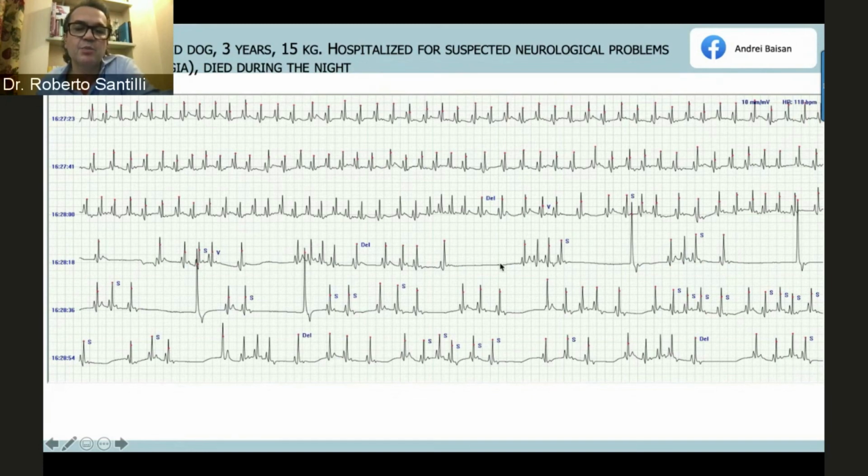In my experience, this is not vasovagal, because for vasovagal I want to see a progressive slowing, but without recovering. You see here, you have a sudden recovery of the rate. This looks like just an imbalance between the vagus and the sympathetic drive. And this is usually, in my experience, due to probably a cerebral problem, maybe high cerebral pressure or something like that, because you have slowing and then fast, slowing and fast.